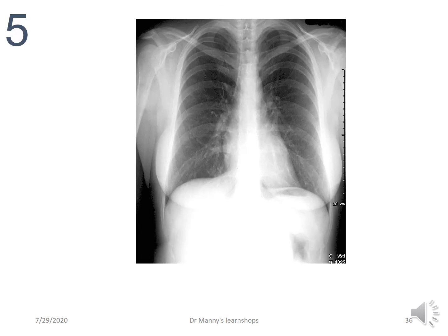Well, what do you think about this one? This is going to test you. I'll just give you a few moments. What do you think? There's symmetry. Heart looks okay. Penetration looks okay. Everything seems to look okay. So it's probably a normal AP chest X-ray.